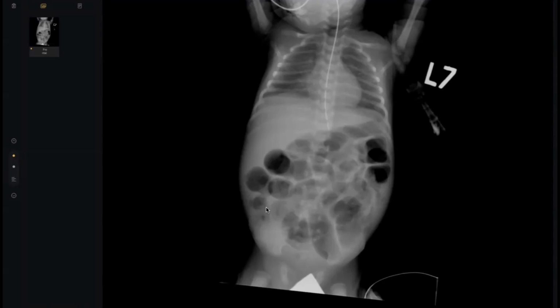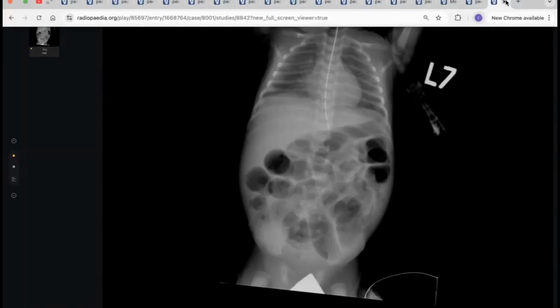Because really, sometimes we are confused. The babygram shows a dilated bowel, it must be necrotizing enterocolitis. But exactly where? Why the mottled gas appearance? This one specifically. There are some here, but here is very obvious. Thank you, doctor, so much. Next candidate.